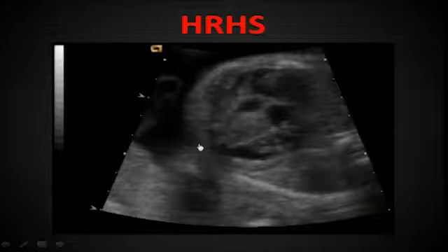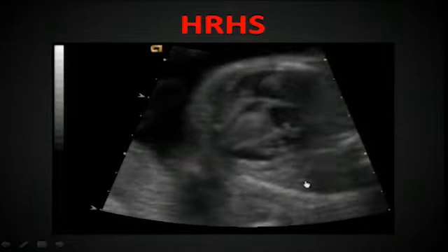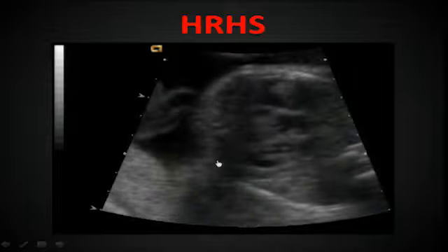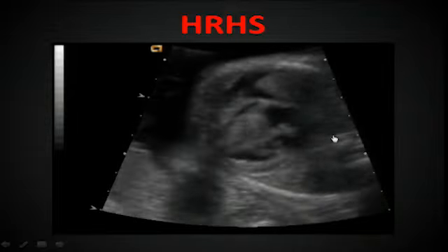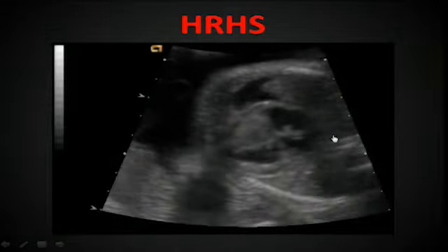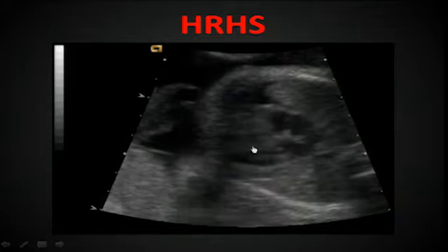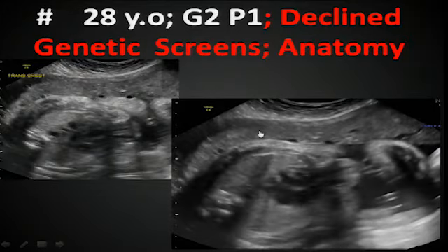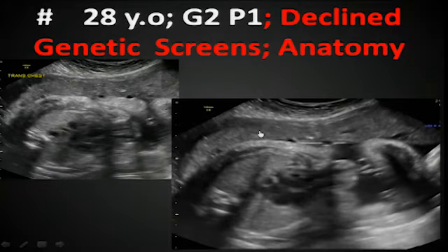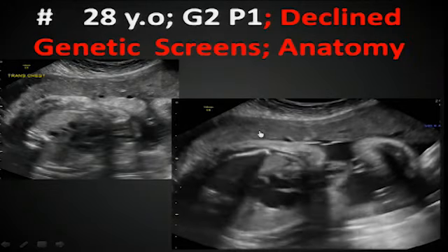So where is the apex? What does the structure of the heart, the morphology of the heart look like? What do I see? What looks normal? What doesn't look normal? It's just the process of going through what do I see, what don't I see. So that's a hypoplastic right heart. Because that muscle is contracting, contracting, contracting, and then it's not able to move blood through it, so it's just getting thicker and thicker and thicker.